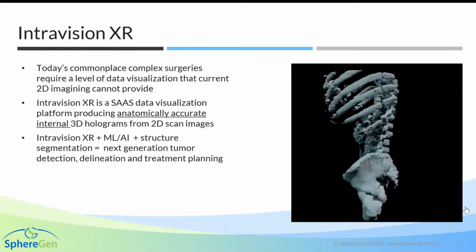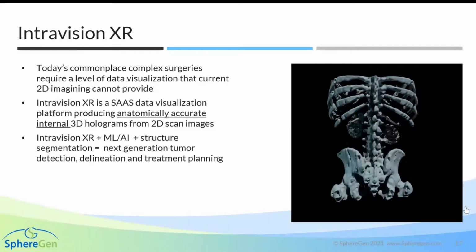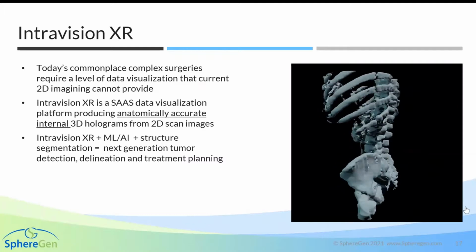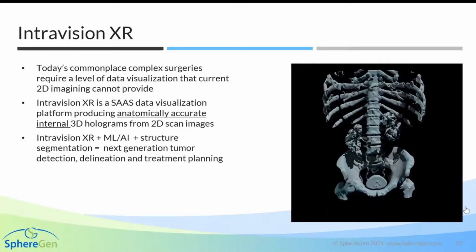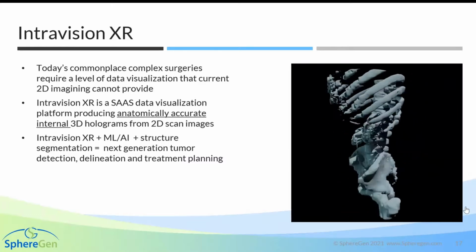We're seeing obviously the bones, but we've also what's called segmented this CAT scan to show us the urinary collecting system. So this was just a timed CT to get a ureterogram, and then we picked these elements out of the CT in order to create the 3D model of just those components. We're not going to look at that one, but that's one of my particularly favorite models.